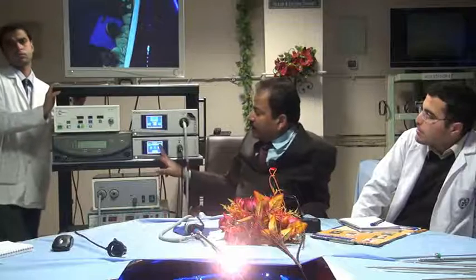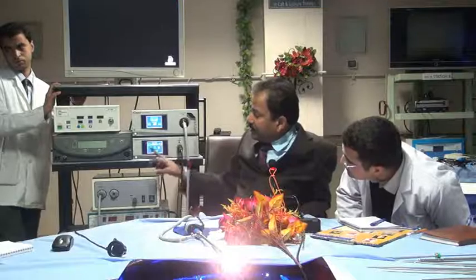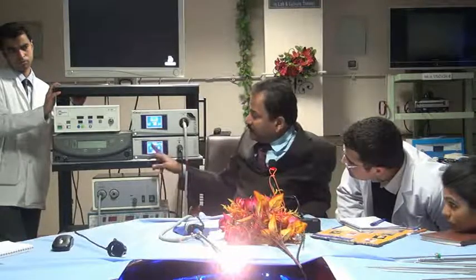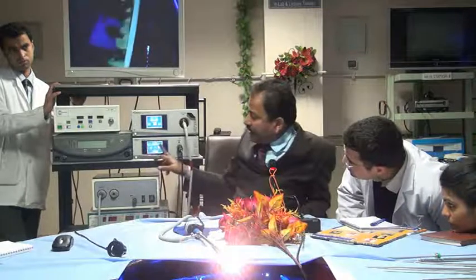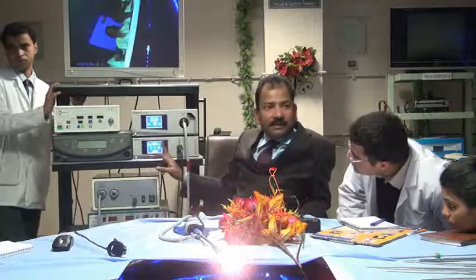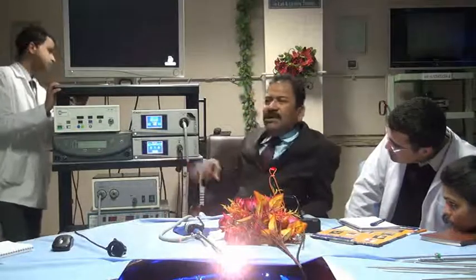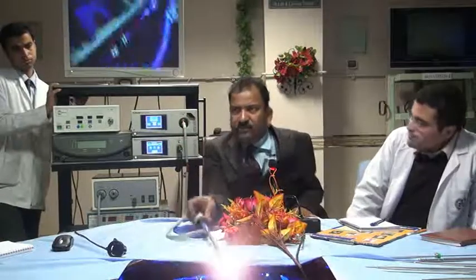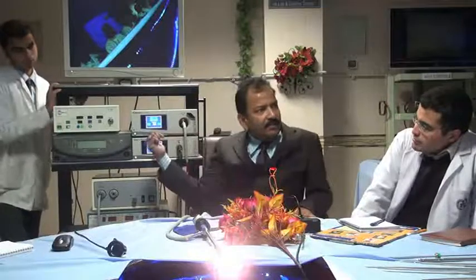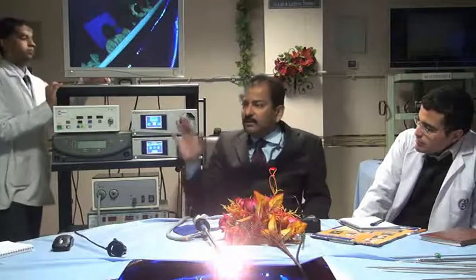So you have laparoscopy, then here laser, which is microscopy, or the setting which is standard, this is arthroscopy, this is cystoscopy, this is ENT, all the settings. So in those situations, you may not have to go into that much detail. Only program your button according to do white balancing, focusing, select the programming, do surgery. Right? So this was regarding the camera.